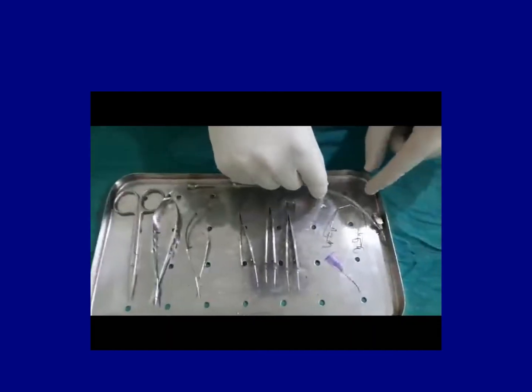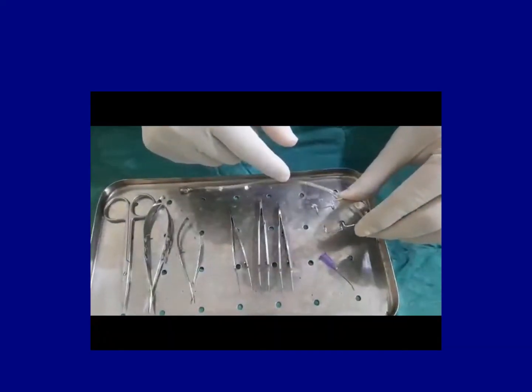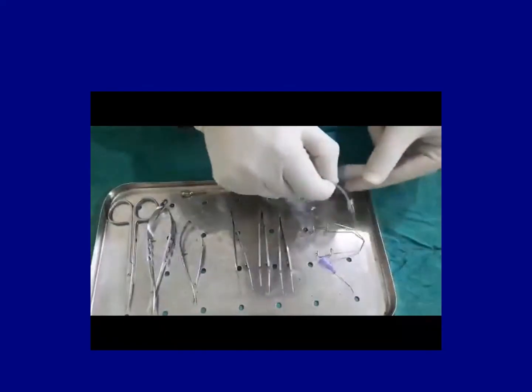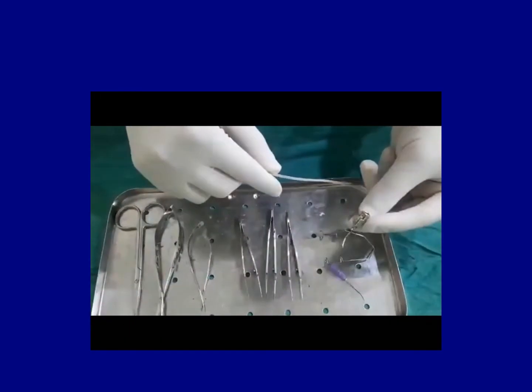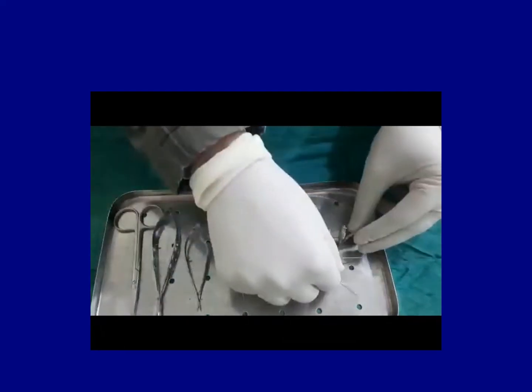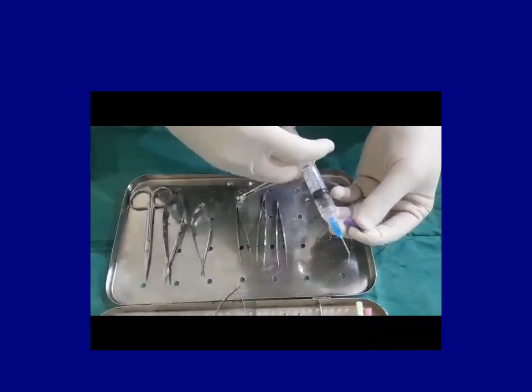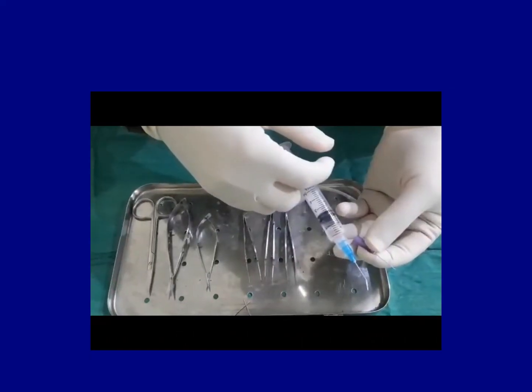The 6th type is these miscellaneous instruments. This is the speculum. We put it in the eye and it goes in like this and opens and retracts the eyelids, so the eyelids remain open during the surgery. This one is a Simcoe cannula, which is an irrigation and aspiration cannula. Irrigation and aspiration is used to remove the cortex from the eye. And this little thing is a cannula. We attach it to a syringe like this, and the water jets can go inside the eye to do the hydrodissection, or sometimes we use it to wet the cornea.